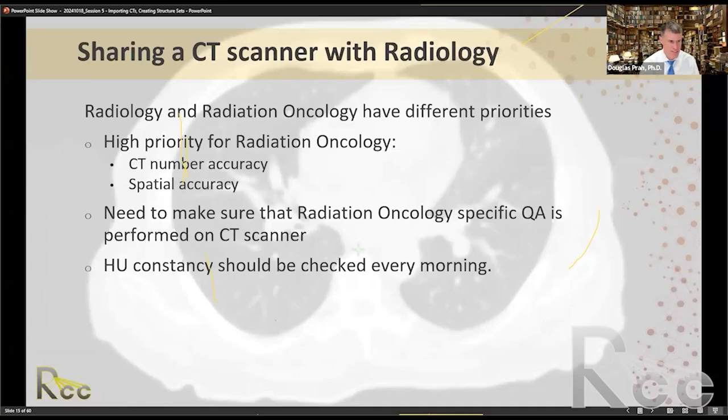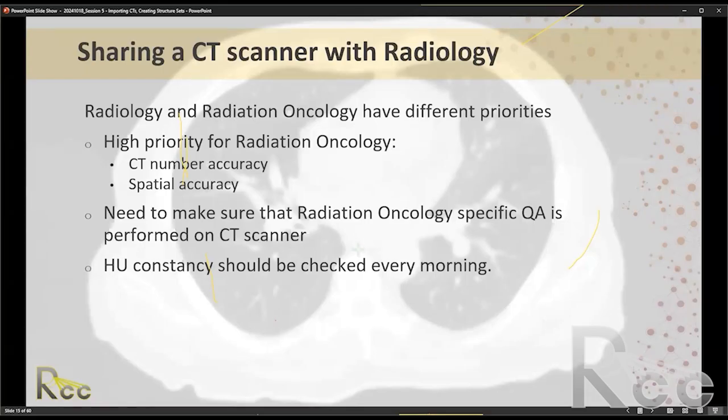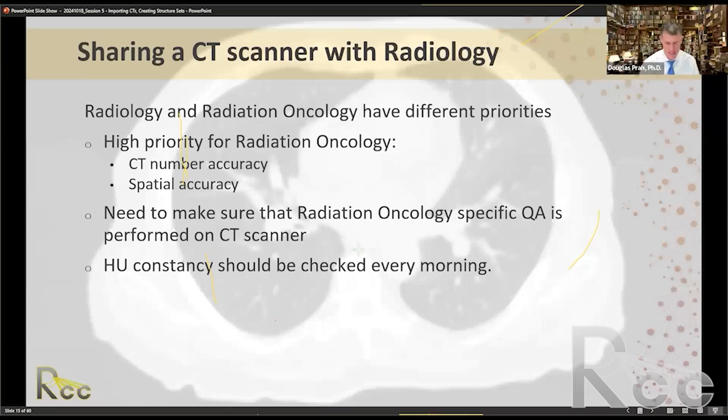In those instances, you should maybe have your dosimetrist or physicist come and take a look at the scan and make sure that having that clipping is going to be a problem. So there's sort of a yes and no to that. But as long as it's within the extended field of view, you can do it after the fact.